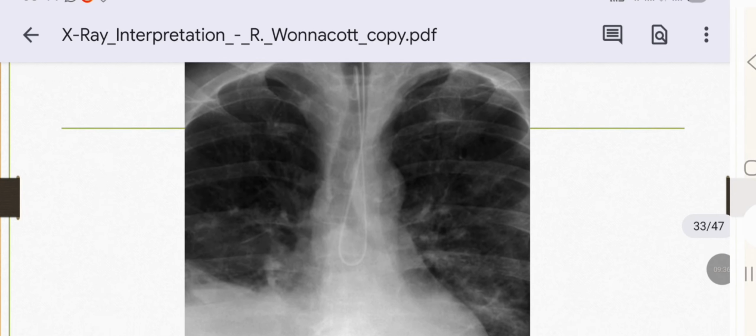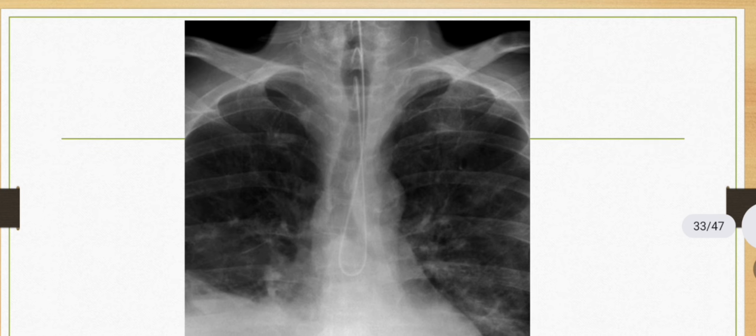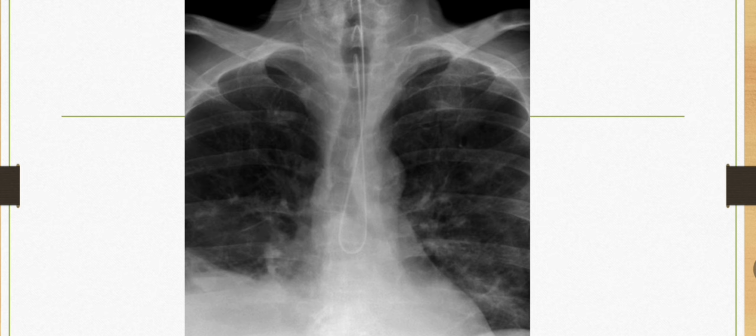Now it's test time. What is this X-ray actually showing? First of all, A for airway. Look at the trachea, which is slightly deviated. There is a left and right bronchus. Now look toward bones and soft tissues: the clavicle, then the ribs, and sternum.